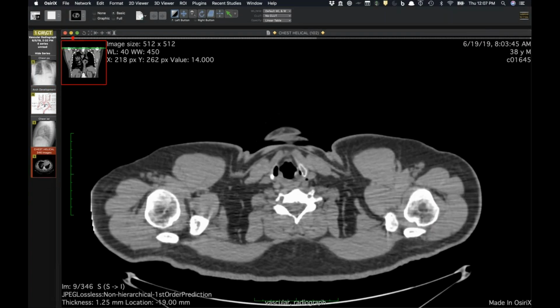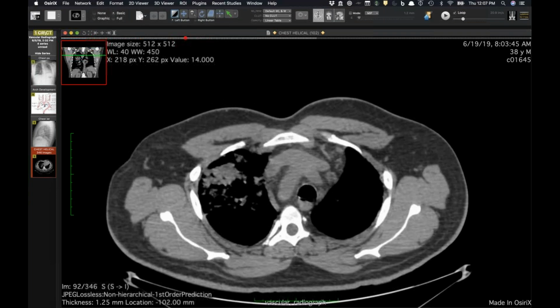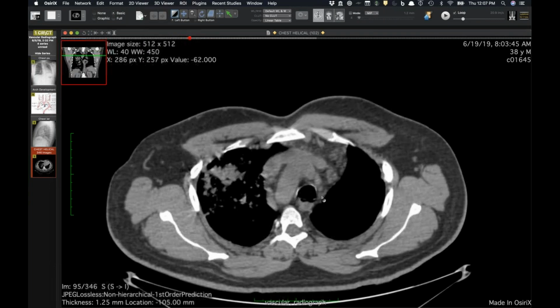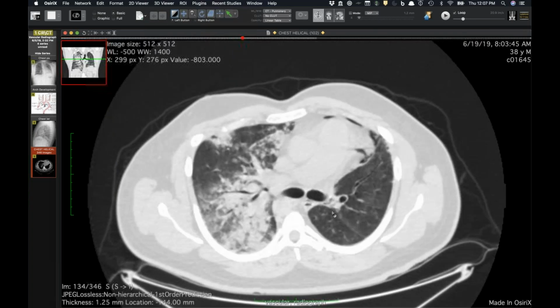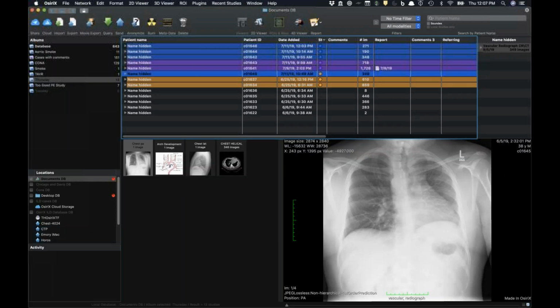I'll make one more comment. I think we can still see in him, since it's a non-contrast study, probably right here off the left subclavian, you can see something headed down a little that may be the ligamentum arteriosum in his case. You can see that he still has some pulmonary arteries, it's just the proximal portion is interrupted.